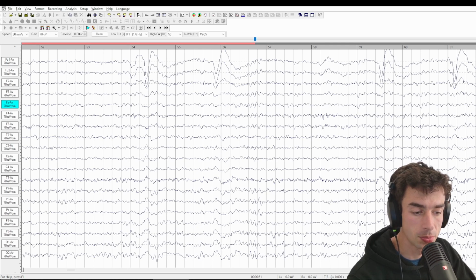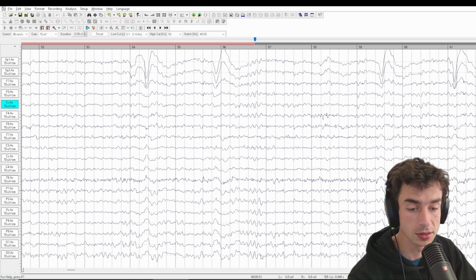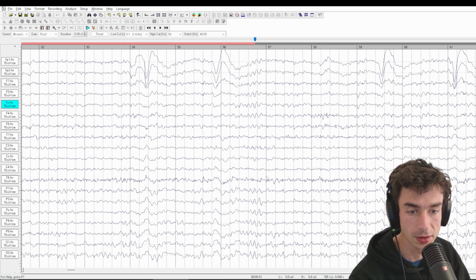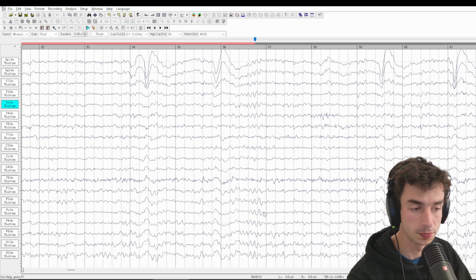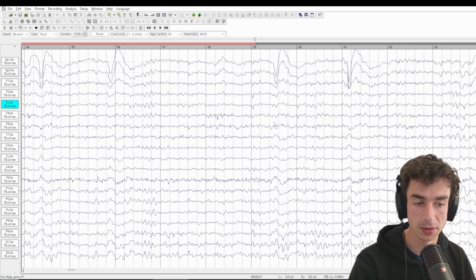Interesting to see how predictably the alpha rhythm at the back of the head emerges after eye blink, and also how it sort of generalizes to the entire head after the eye blink, right? So that's another sign that there might be some drowsing. Usually alpha starts at the back of the head, and as there's more drowsiness, it goes to the front.